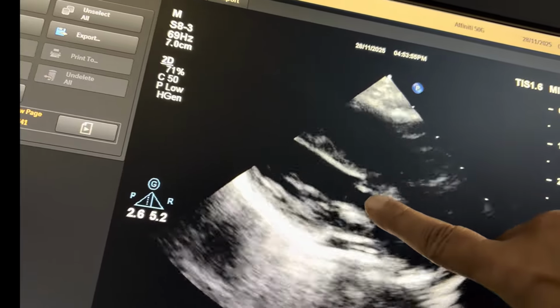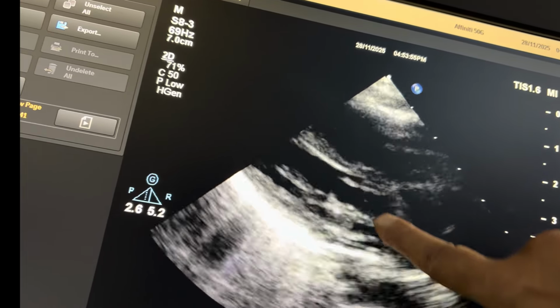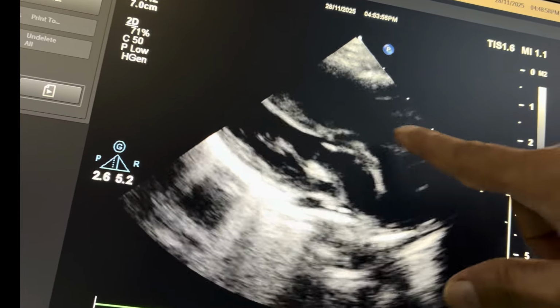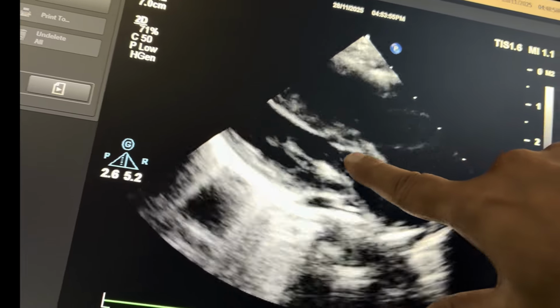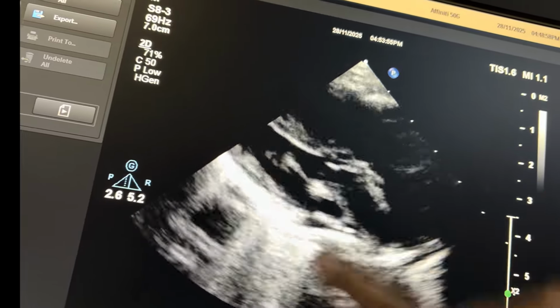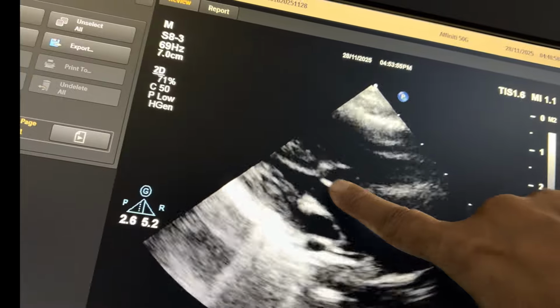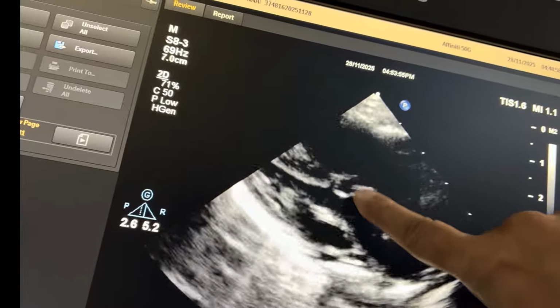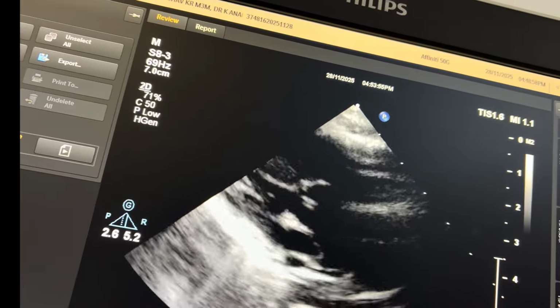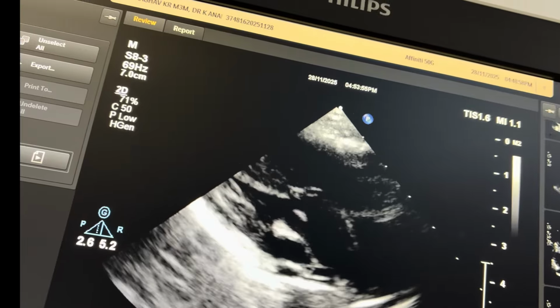Aorta from left ventricle, sorry, pulmonary artery from left ventricle. It is the pulmonary artery, which is why it immediately goes posteriorly. You see, this part of the screen is anterior and this part is posterior. So the pulmonary artery coming from the left ventricle immediately goes posteriorly. That is a characteristic point of transposition of the great arteries. Whenever you find transposition, you will find the pulmonary artery coming out of the left ventricle and immediately going posteriorly. But if it were the aorta, it would go anteriorly in the initial part. That is the point of difference between transposition of the great arteries and the normal case.